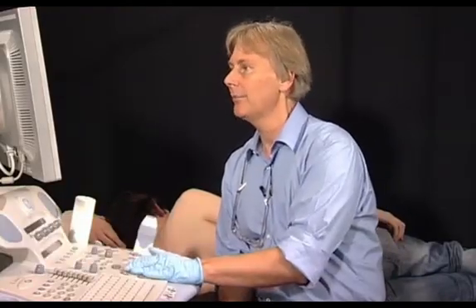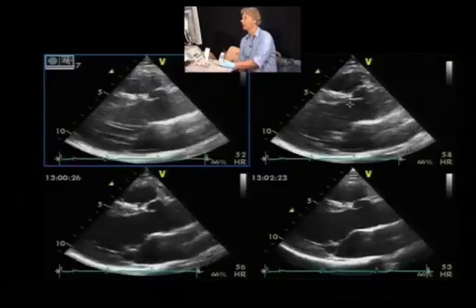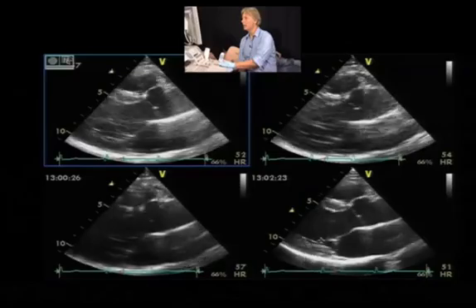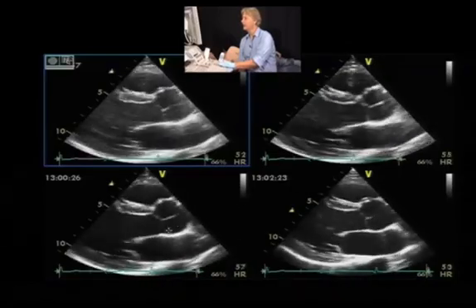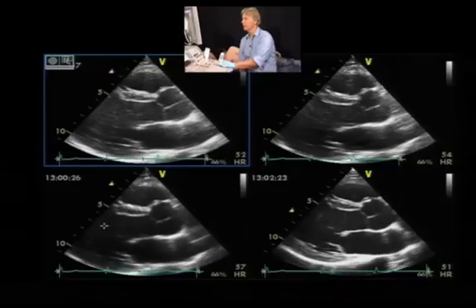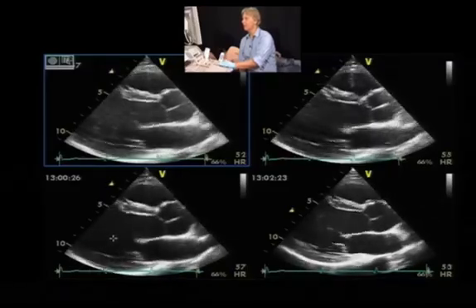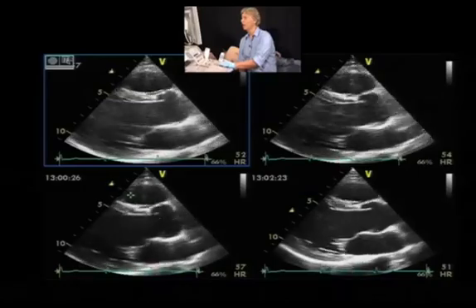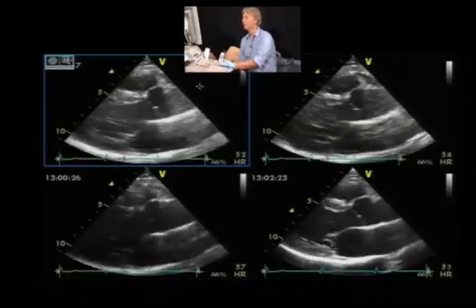Harmonic and fundamental imaging gives us a bit of a different characteristic of the image. Here's an example. On the top, we have two different frequencies of fundamental imaging, and on the bottom, we have two different frequencies of harmonic imaging. You can see that with harmonic imaging, usually the cavity and the heart chambers themselves, or the inside of the chambers, are dark, while with fundamental imaging, we have more artifacts or speckles within the image.